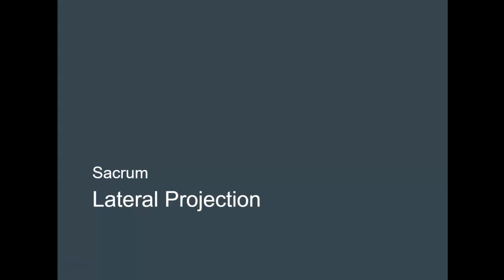However, I do understand that you will not perform a lateral coccyx and then a lateral sacrum. You will do it all in one. But the image analysis guidelines still are applicable to your projection. Centering might be a little bit different, but when completing the image analysis quiz, keep in mind some of these guidelines are more tailored towards the sacrum projection by itself and the coccyx projection by itself.